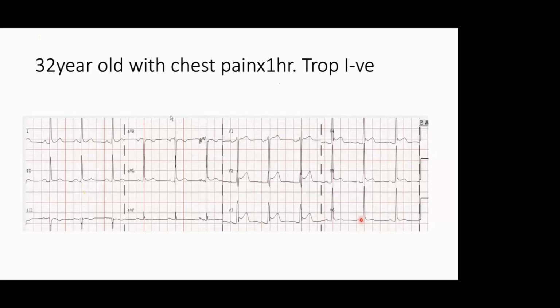We have a lot more ECGs to tell. Just to tell the diagnosis, it is enough if we can just point out the J point elevation. Yeah, J point elevation. And so what kind of pattern is this?